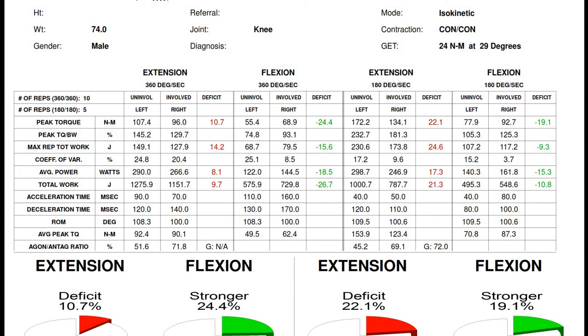You would have to talk to the participant beforehand, but this is certainly something that when they came in for a second test, you would want to bring up that it's very important to reach the full range of motion. Likewise, it could just be an issue with familiarization, but as this is the involved limb that consistently doesn't reach the full range of motion, and assuming that the range of motion was the same between the two tests, then we would be tempted to assume here that perhaps this is linked to this underlying condition, this underlying injury that we have.